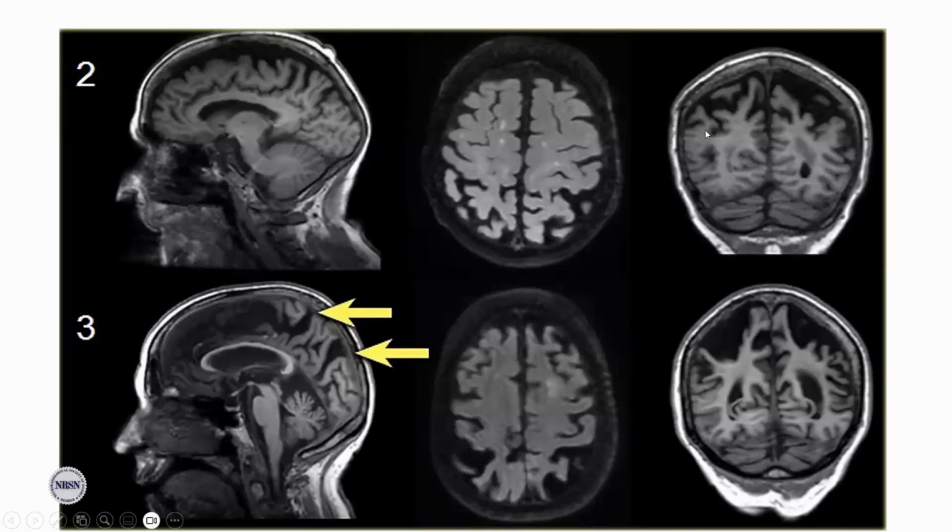Now, for coronal T1, we can appreciate this extensive, substantial parietal lobe atrophy. It's interesting that the medial temporal lobe may be normal in these patients, but because of this score, we're able to also know patients that can convert to Alzheimer's disease, which is primarily in the hippocampus.